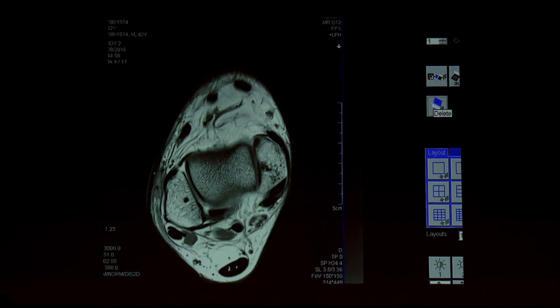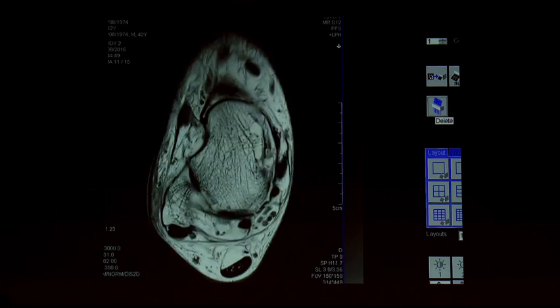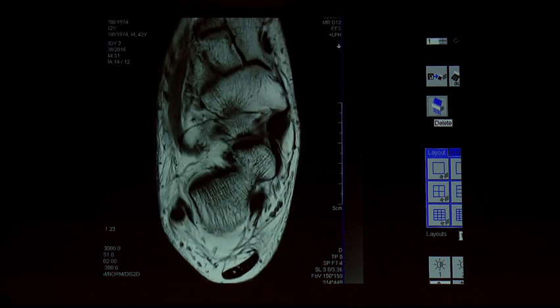And how to remember these tendons: this is bone, close to bone, B for B. So peroneus brevis will be close to bone, and it is boomerang shaped or linear shape. So it is peroneus brevis, peroneus longus, and you can see the superior peroneal retinaculum. So I am going down, and you can see how nicely it is placed and kept in place by the superior peroneal retinaculum. I am going down inferiorly.